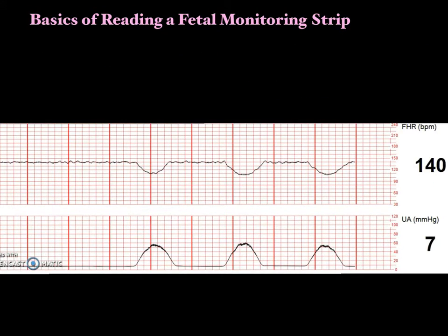Okay, and next we have earlies. Early decelerations aren't a bad thing at all. They mean head compressions, and I'll explain the pathophysiology behind that. Early decelerations, let me show you what happens.